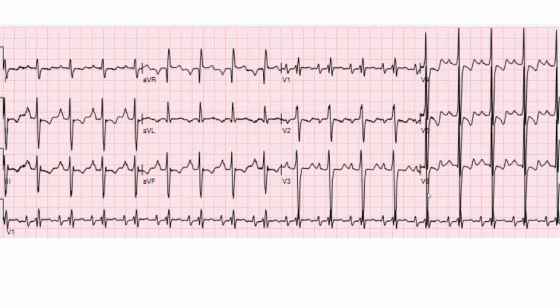He doesn't have just big R. He has a huge S in the left precordial lead. And interestingly, the S in the right precordial lead is not that pronounced. You meet the Sokolow-Lyon criteria based on the size of the R in the left leads, not so much because of the S in the right leads. So what does this tell you? And you have a northwest axis, which I said LVH doesn't cause major axis shift by itself. Here you have a northwest axis.